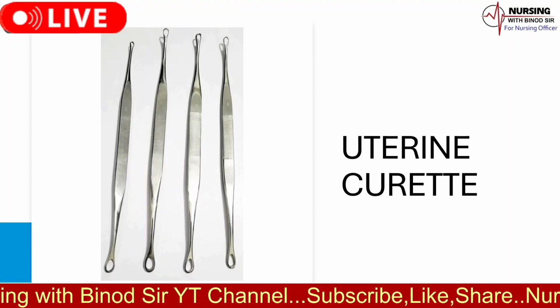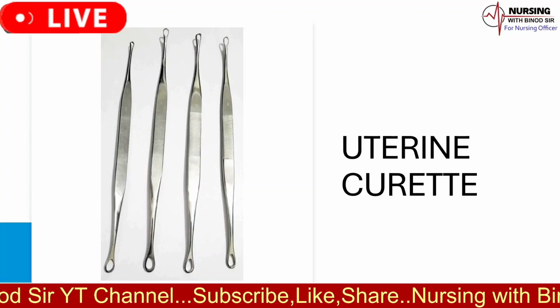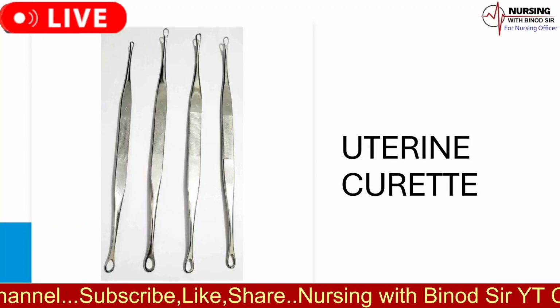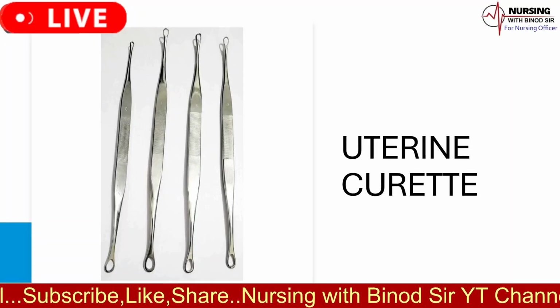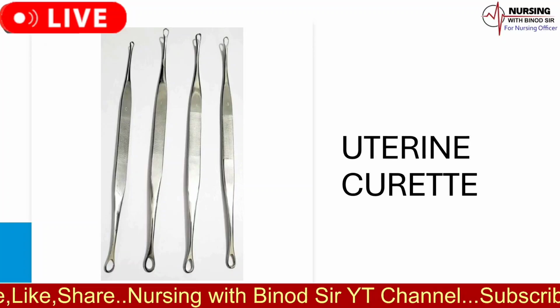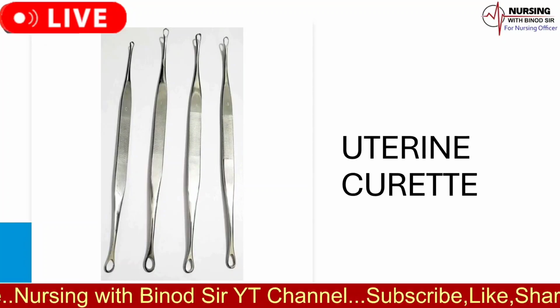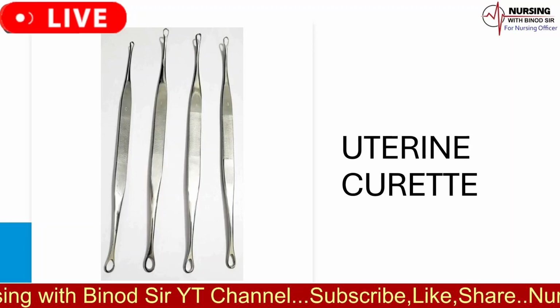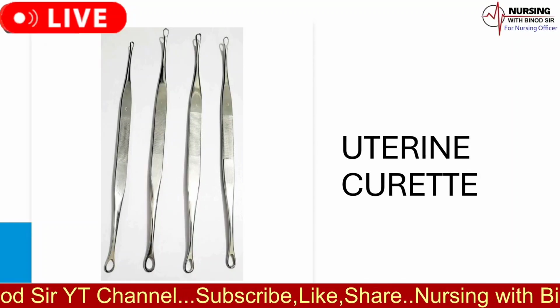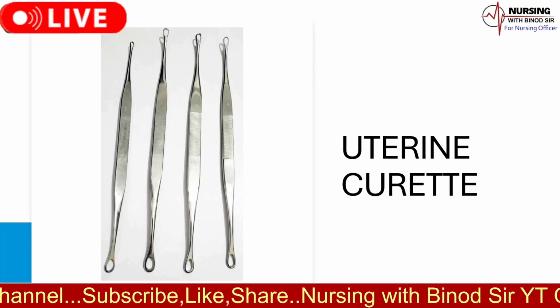5. Treatment of postmenopausal bleeding. In postmenopausal women, the curette is used to clear the uterine cavity for hysteroscopy or other diagnostic procedures. 6. Aspiration of retained placenta. Following childbirth, it assists in removing any retained placenta pieces to prevent infection or excessive bleeding. 7. Diagnosis of irregular menstrual periods. By scraping the uterine lining, it can help identify reasons for irregular menstrual cycles.